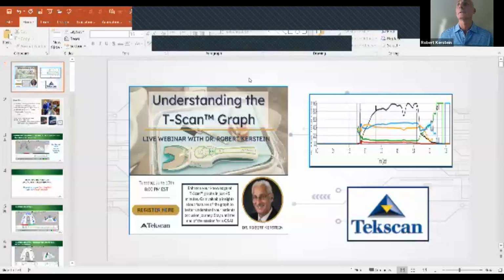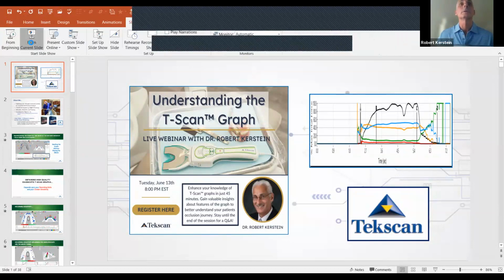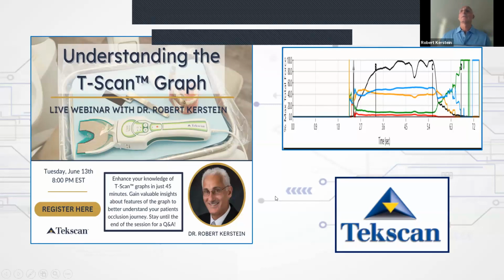This session is really about the force versus time graph, and that's a very important TScan topic. So I'm going to go right into it so that you can get a feel for it. And let me just put on the slideshow. There we go. Okay, so understanding the TScan force versus time graph, which is what you see here that my mouse is pointing out. To an untrained eye, it's a complicated series of colored lines, but to a trained eye and to a TScan user, it's one of the most important software features that you have to learn to understand.